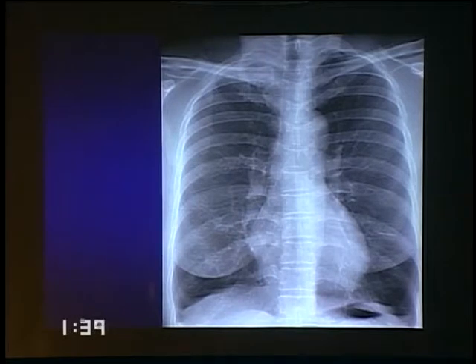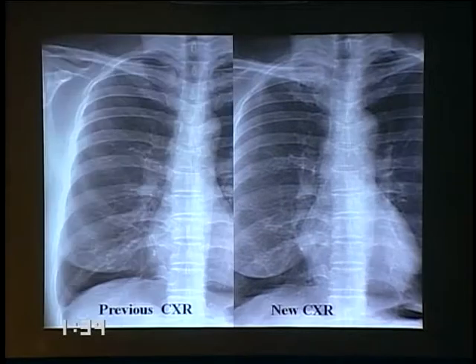programs. So when we're looking at a chest X-ray like this one, it may have an opacity up at the apex. Pretty nonspecific, could be scarring. If we compare with the previous, and a lot of the time we are comparing with previous, now particularly with digital archives, there's a higher percentage that we can actually retrieve the previous one.